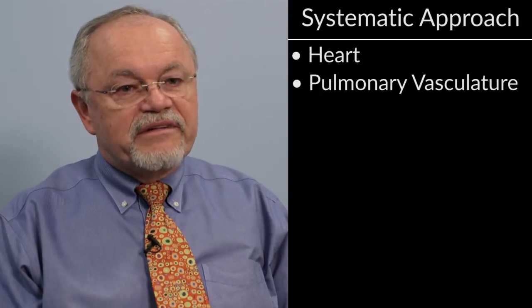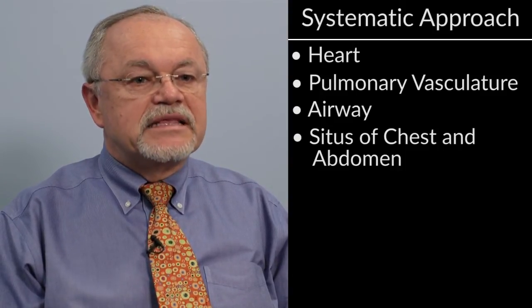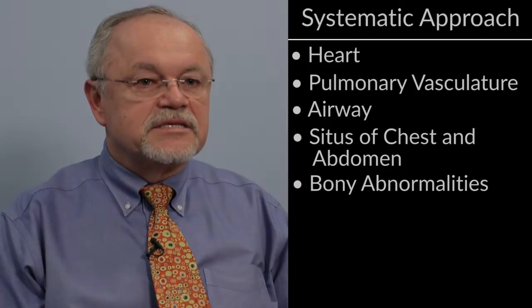We will be following a systematic approach to the evaluation of the chest X-ray, focusing on the heart, the pulmonary vasculature, airway, the situs of the abdomen and the chest, and bony abnormalities.